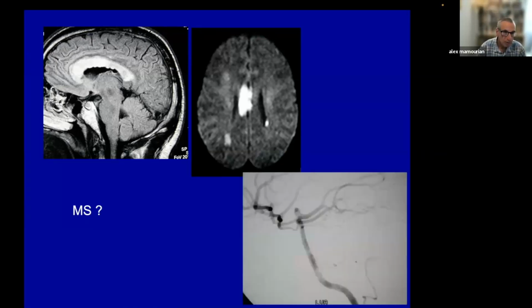But this is a patient who you can see has bilateral carotid disease, has hypoperfusion probably of the anterior cerebral arteries since all of the flow is coming retrograde through the posterior communicators from this basilar injection. You can see this unusual filling of the anterior circulation from the posterior circulation. So usually in patients with corpus callosum infarcts and white matter infarcts, but more specifically callosal infarcts, they tend to have quite evident vascular disease.